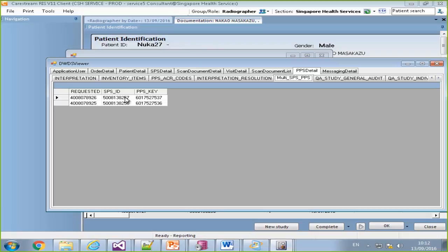Is there any impact on the linking of the events? It's done separately from linking, so you still launch the link manager separately. You can still launch the link manager independently, and you can link the ones that are documented together. You can link across Document Together groups. The link manager didn't change whatsoever.